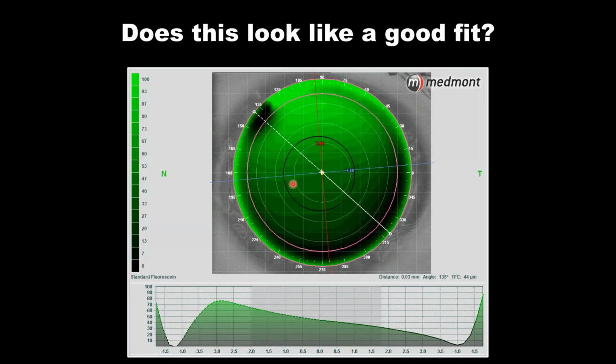We have a with the rule cornea where the lens should land at 3 and 9 o'clock, but because of this false hotspot, this false high spot, the lens appears to want to have a bearing point on that high point and then finds an opposing point down here. Remember, again, this is a with the rule cornea. The flat meridian is very close to 0 and 180, so the landing of a rigid corneal GP should be along the flattest meridian, 0, 180, not at around 1030 and 430.